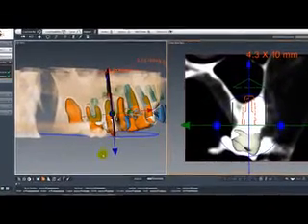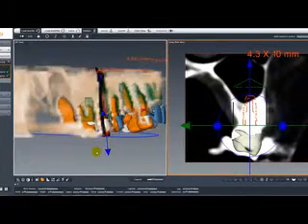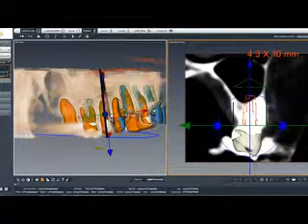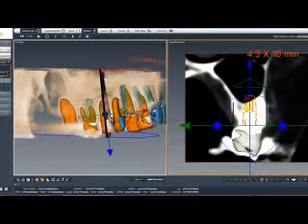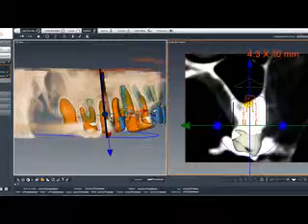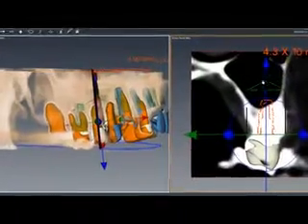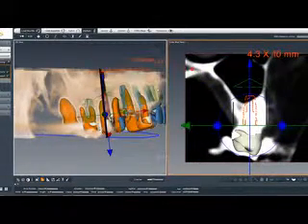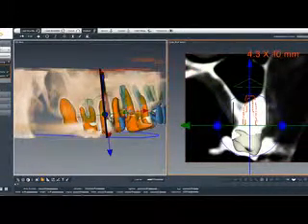So we're going to go to the next implant, which is tooth number 4, and as you can see, I'm trying to make it a little bit more mesial to the root of tooth number 4 that's in there. And as you can see in the 2D view in here, the root kind of takes the buccal lingual roots. There are 2 roots in here, taking pretty much most of the width of the ridge, and I'm proposing a 4.3 by 10, and as you can see, we're in the sinus, and we may even use an 11.5 if possible, if we decide to do a socket lift or a sinus graft. So this will be a 4.3 by 10 or possibly an 11.5 with a sinus graft.